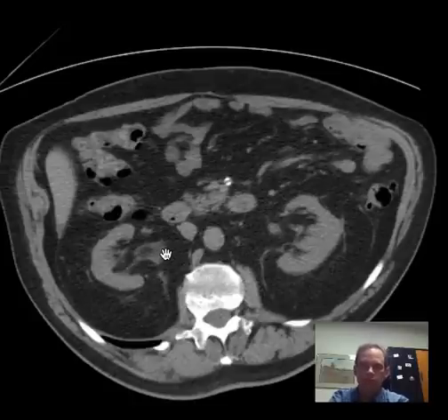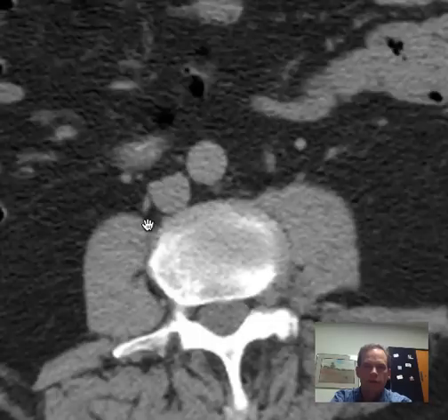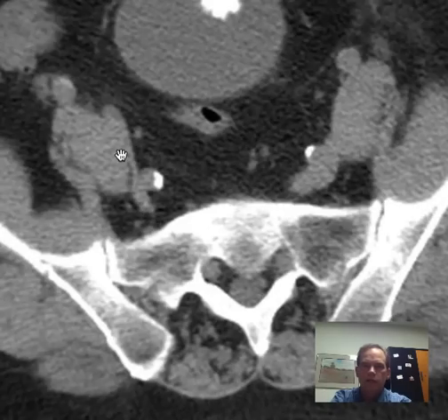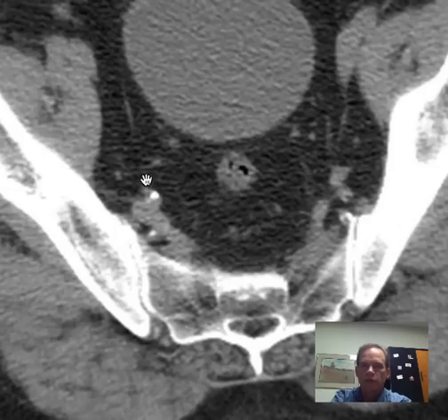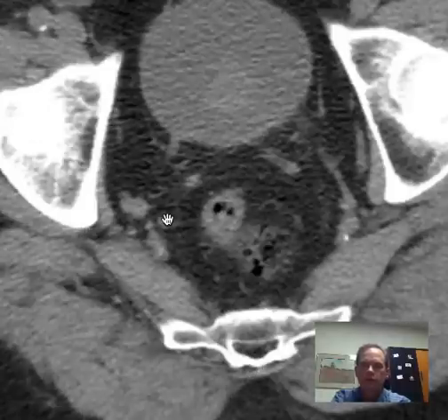That's one of the tricks of the game, is to follow that ureter there. And let me zoom in a little bit. There it is there. And you can still follow it if you're careful. You can stay right with it right there. Okay, and here it is here. And you should be able to see it join the bladder. And it's not this, it's this little thing right here. So let's see, and sure enough, there it goes right to the bladder.